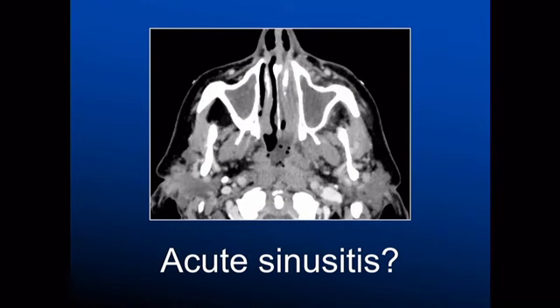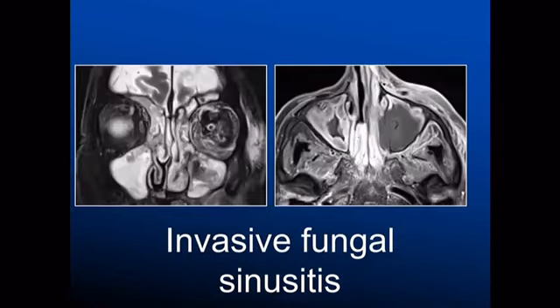And finally, another case of fungal sinusitis, because we don't appreciate it well on CT, so I'm just labouring the point here. That retromaxillary fat, this was a case last week, is what you should be looking for. This is the key sign for invasive fungal sinusitis, and often you will have opacification in the posterior aspect of the nasal cavity as well. And then the associated MR, just showing the disease which has progressed into the orbit.